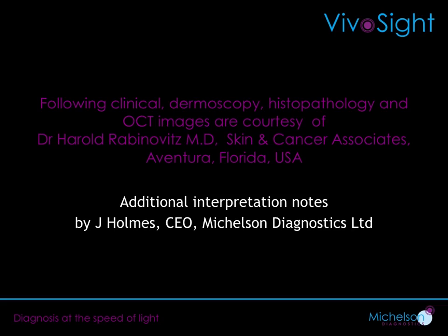It's important to note that the resolution of the images you're about to see has been significantly affected by the compression that YouTube applies to the video in order to host it on the web. In other words, new customers of VivoSight will receive a much higher resolution version of the presentation that's easier to interpret. That said, this video is certainly sufficient to get a good feeling for the different characteristics which you'll need to look out for with OCT.